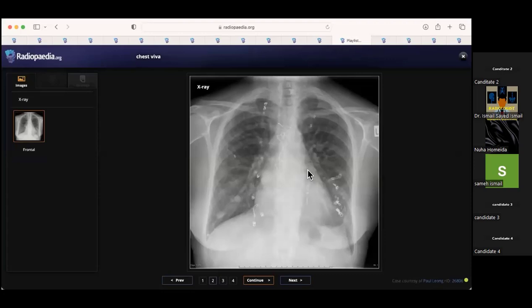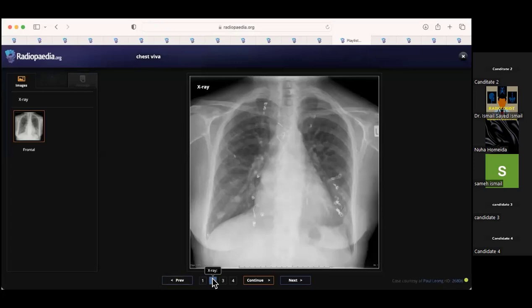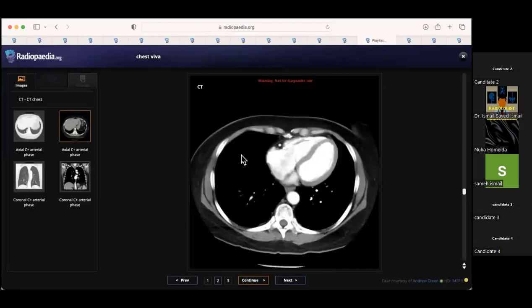You could say that I can't see any evidence of peri-hilar opacification, as these patients tend to present with pulmonary hemorrhage. Another important finding is heart size. Perhaps it's not the ideal projection, but these patients tend to present with high cardiac output failure. The important thing is pulmonary hemorrhage in the acute setting. I think Dr. Ismail said before to check for important or emergency things: pulmonary hemorrhage, that's how they tend to present to A&E, and heart failure, high cardiac output failure.